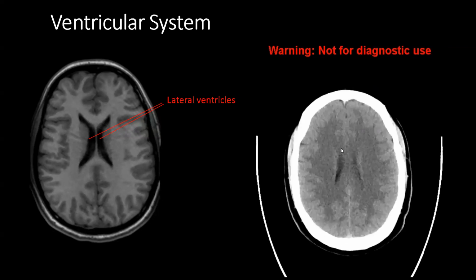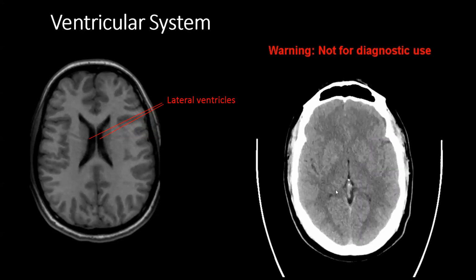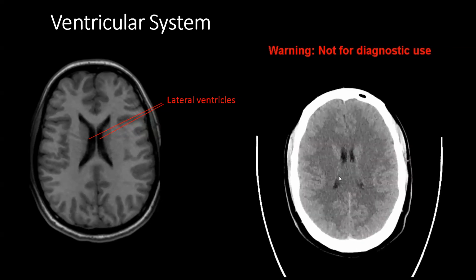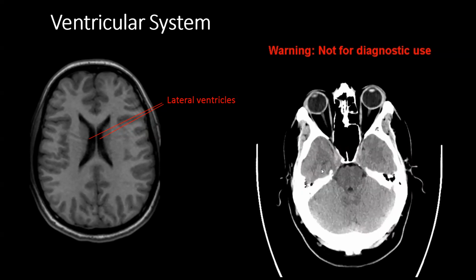If you have a healthy young patient with a pretty full, normal, healthy brain, usually the lateral ventricles are quite small, as in this case, and you can't always follow their anatomy to visualize the entire lateral ventricle. For example, if I follow the lateral ventricle along here, you're kind of losing it, and in reality, it tracks forward to communicate with this structure here, and on the other side here, which is the temporal horn of your lateral ventricles. It just becomes collapsed and low in caliber, beyond the resolution of CT in healthy patients much of the time.